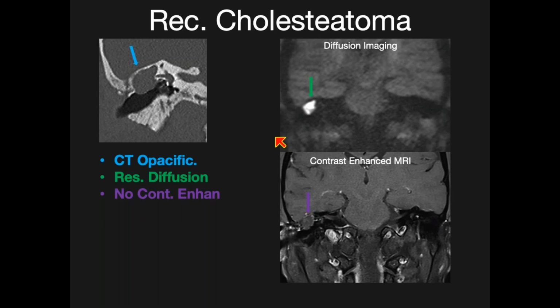Patients with cholesteatoma undergo surgery, and some of them come back a little later with recurrent discharge. So this is a patient 2 years down the line after their surgery, and when we do a CT, you can see that opacification within the mastoid cavity. You can't see much of the mid-ear structures here. We know that this is a post-op case. Is this recurrent cholesteatoma? Is this granulation tissue? It's quite difficult to say. Clinically, it's quite difficult to say, and on a CT as well.